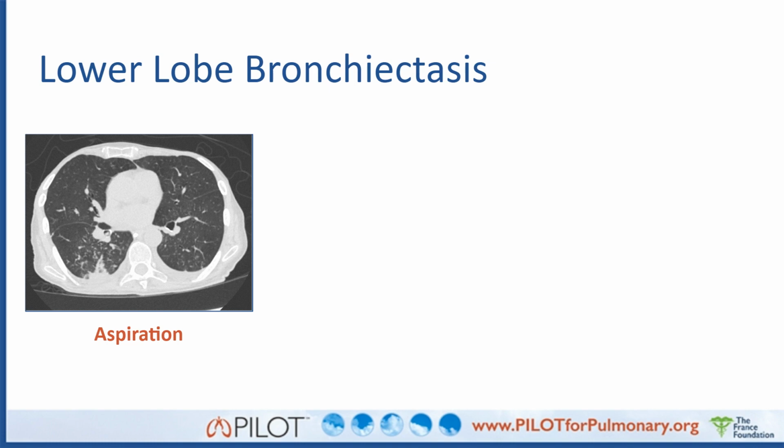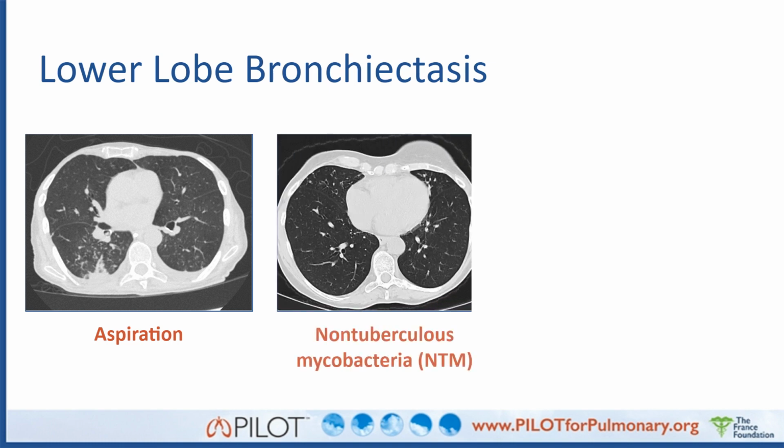As in the patient that we showed earlier, non-tuberculous mycobacterial infection is very common, maybe 3 times a day. In a pile of 30 CT scans, I'll see this diagnosis of MAI with dilated bronchi, characteristically in the right middle lobe and the lingula, and more common in females.